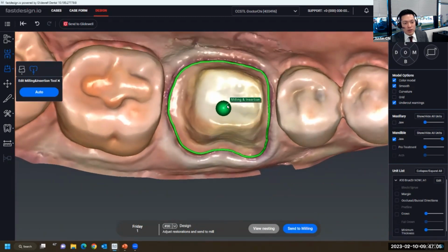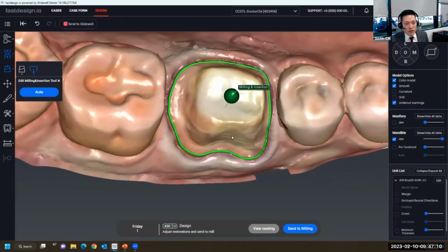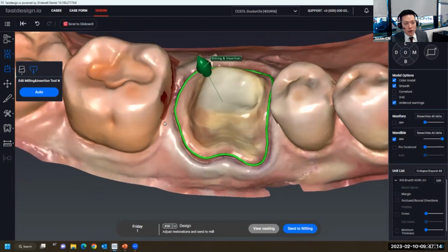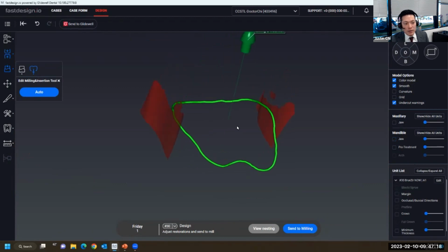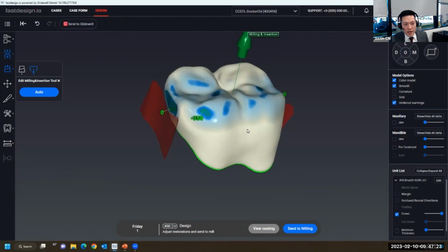And there are undercuts over the adjacent teeth too. That's the final thing I want to touch on for this case. As you can see, there's little curtains over the adjacent teeth showing where those undercuts are. And these adjacent teeth don't really have steep undercuts. I can hide the model. And just to show you, I can bring the design back.